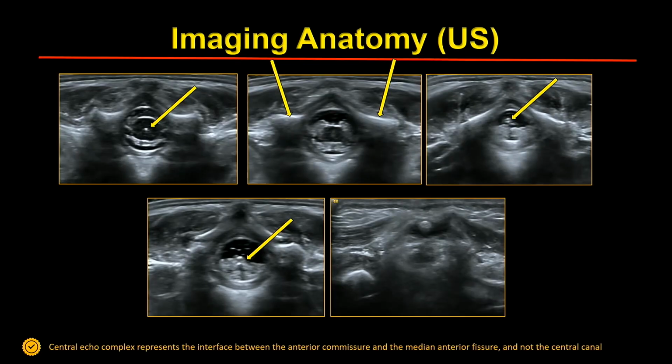Now, it's important to remember that the coccyx is not ossified at birth. So if you do a transverse imaging of the coccyx, it can look weird like this. So do not confuse an unossified coccyx with a fluid collection or an abscess. And that is not a dilemma if you're doing cine images in a longitudinal plane.